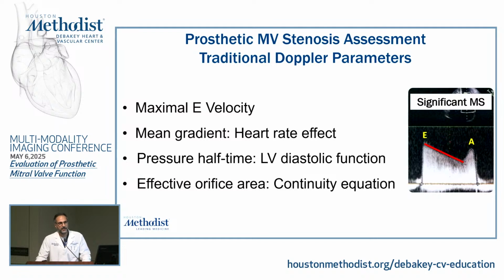If you have a gradient that is high at 100 beats per minute, or if it's high at 60 beats per minute, to me personally, I favor and put more weight on the gradient because I think this is what the patient is feeling right now, and I give it an equivalence to diastolic function. You can have a patient who is grade 1 diastolic function that can go to grade 2 or grade 3 in the right conditions. When we read the echo, we report it as grade 2 or grade 3, and then if they're diuresed, they come back and it's grade 1, and this is how they're feeling at that time.